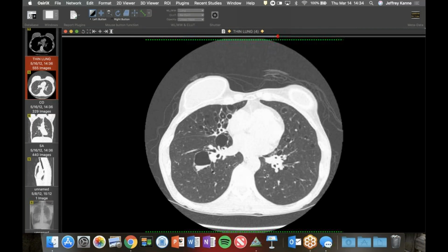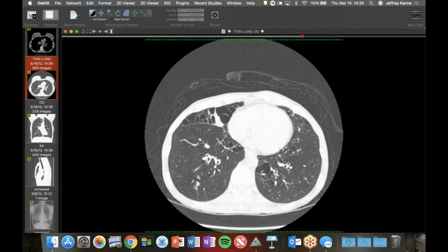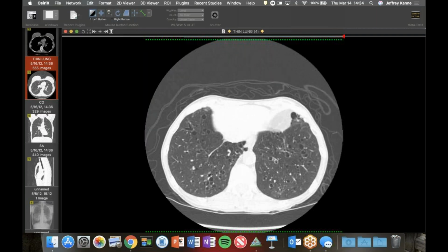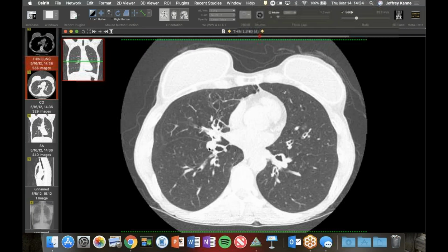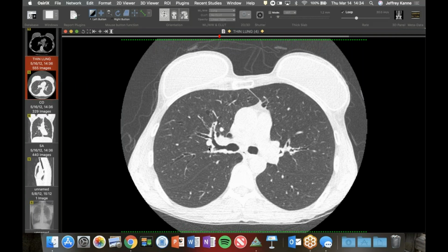This looks like features of LIP, right, with these cysts, but we know that with LIP you can get amyloid deposition, and then you can get amyloid without, at least based on your biopsy, you don't see the lymphocytes, you just see the amyloid. But clearly centered around airways as well. I think there's a lot of plugging in here because of the narrowing. But it's a very interesting case. I don't know if any of you have ever seen a case of tracheobronchial amyloid with parenchymal involvement.